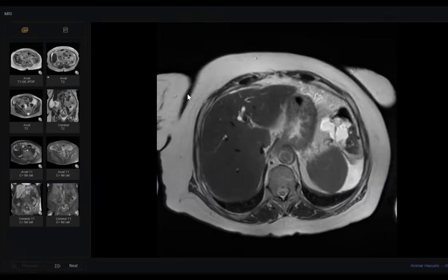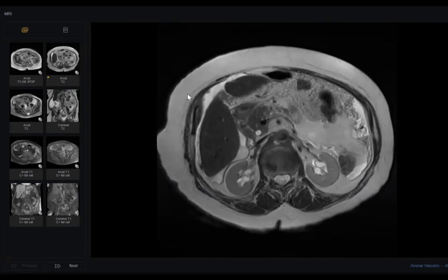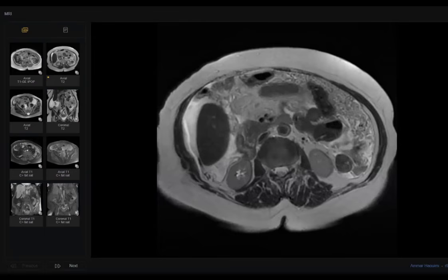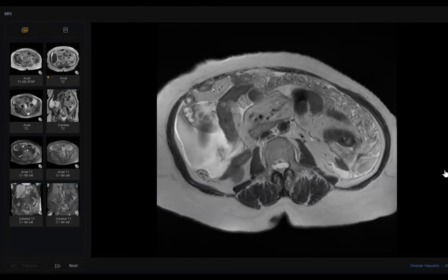Can you request control? Yes, sir, I have requested, sir. Go on. Just 1 minute, sir. Sir, I'm not able to... Yes, sir, I think I can. I can scroll it now.